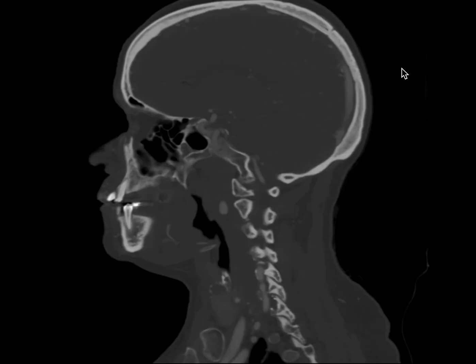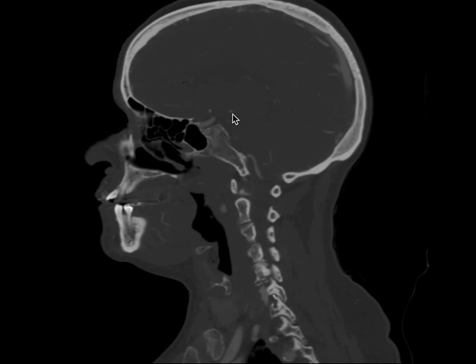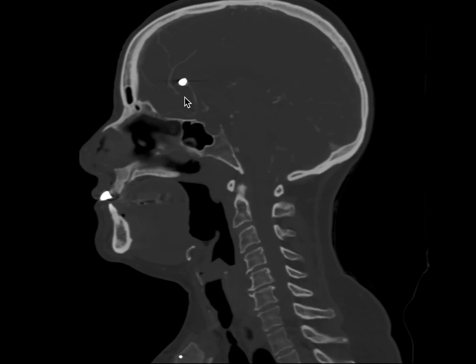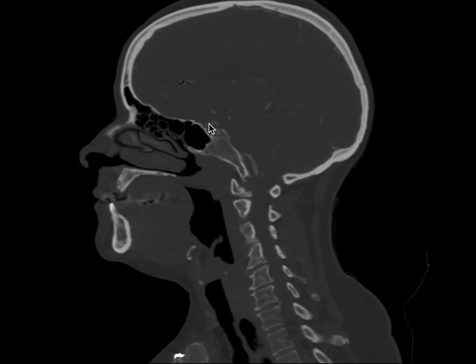We'll now review the circle of Willis on our sagittal CTA images in a patient who is noted to have a couple abnormalities. First, I'll point out the right internal carotid artery terminus right here, and the posterior communicating artery coming off right before the terminus and extending posteriorly. This is a small branch in this particular patient, and as I scroll toward midline, we'll see it connect up to the right posterior cerebral artery right here. Anteriorly, we have the A1 segment of the right anterior cerebral artery as well. Now scrolling further toward midline, we'll see the anterior communicating artery right here, and the A2 branches extending up in the interhemispheric fissure.